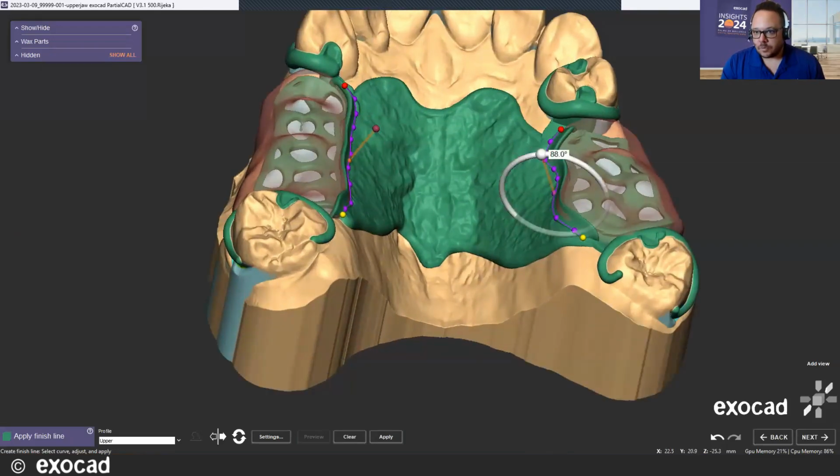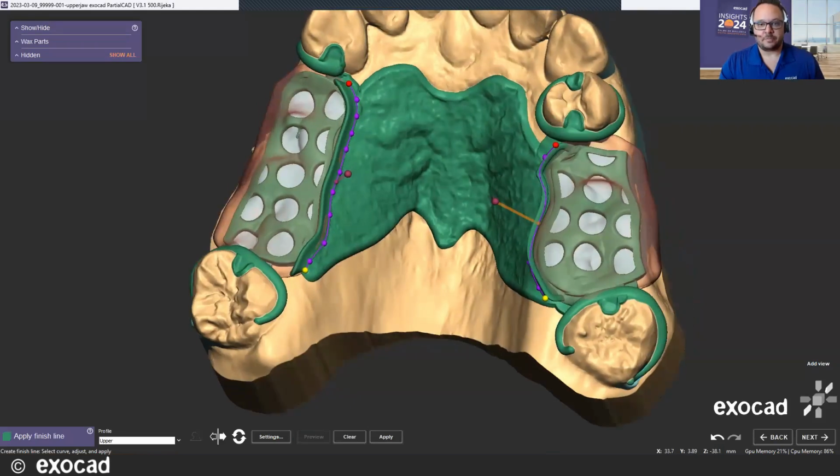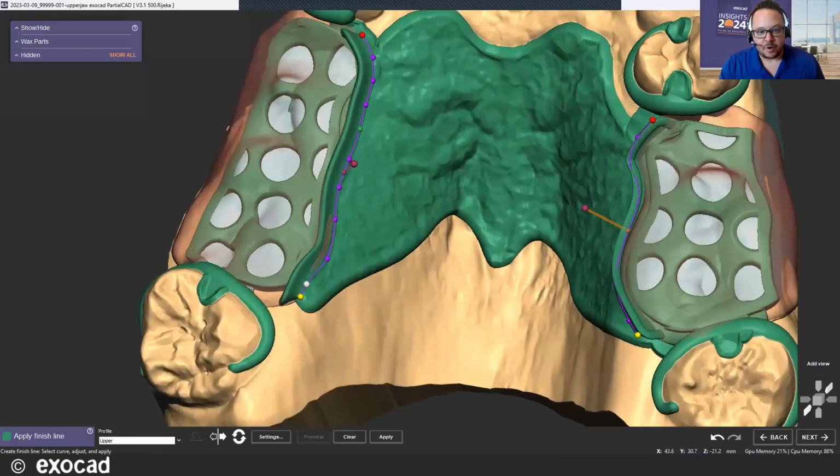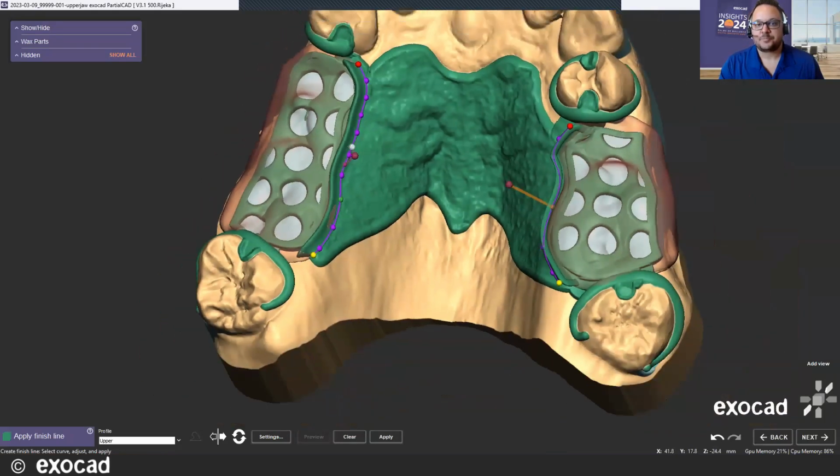Which will show us doing this way. Actually, it'll be kind of nice. We'll actually show you some of our expert mode functionality with the automatically added in parts. So it's actually a pretty cool feature we'll go over.